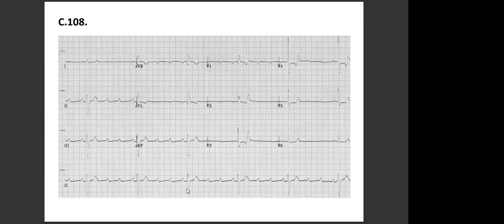And so I think this is a high grade AV block. Is it right? So that was a high degree AV block, yes? Yes, and I'm trying to use another headphone, but it doesn't work, so I'm sticking to my old fashioned one.